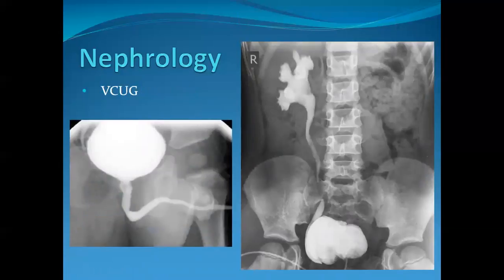Let's talk a little bit about a VCUG, and depending on what your practice is, you may or may not be familiar with VCUGs or use them or order them, but I want to go over them a little bit to show kind of what we see with them and how they're performed and primarily what they're used for.